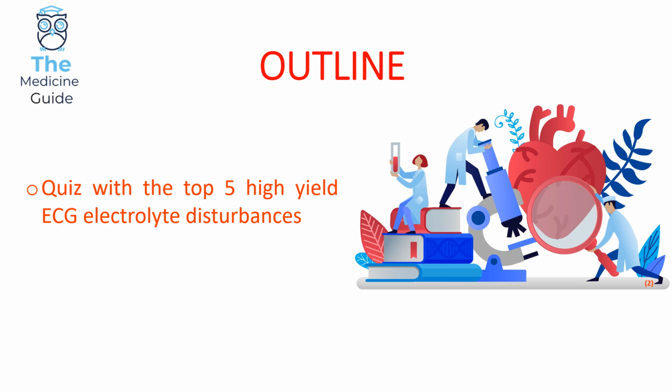So today's video is going to be more of a quiz. This quiz will involve the 5 high yield ECG electrolyte disturbances. I'll have 5 questions with 5 different ECGs, and it will be up to you to diagnose what you think is a possible underlying electrolyte abnormality leading to this particular ECG. I'll give you about 20 seconds for each ECG.